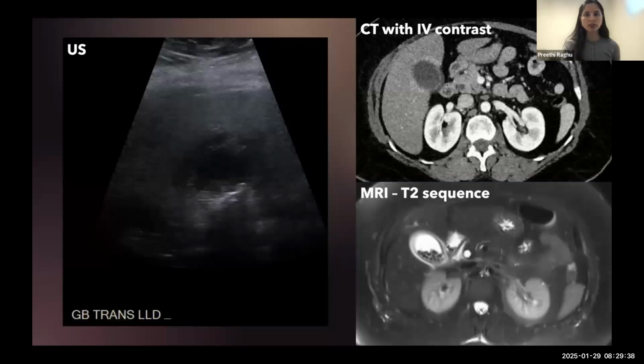So first, for things like cholecystitis, this is a patient with right upper quadrant pain, where on ultrasound we see lots of echogenic foci with shadowing within the gallbladder. So it looks like a lot of stones. And then this gallbladder wall was a bit fuzzy, and so there may be some wall thickening. It's hard to tell. This person did actually end up having a CT, and note that we don't see any of those stones on CT. And there was mild wall thickening there.